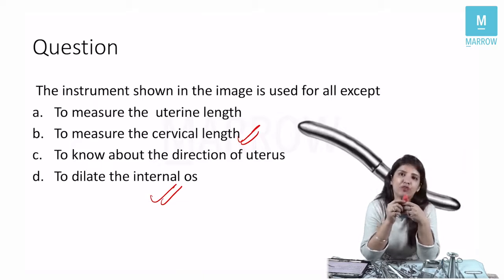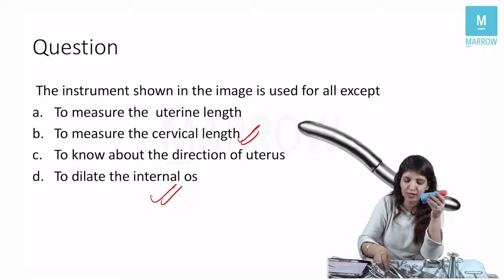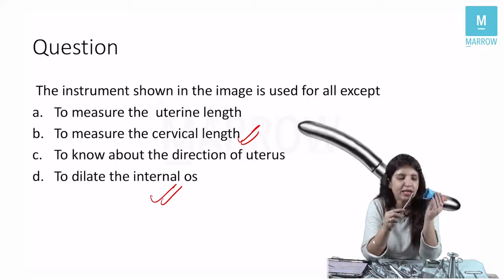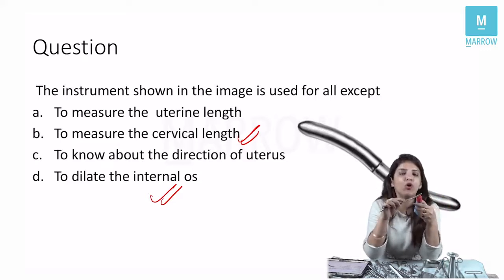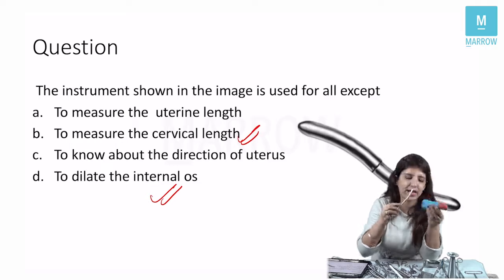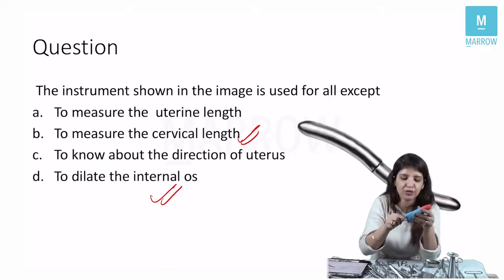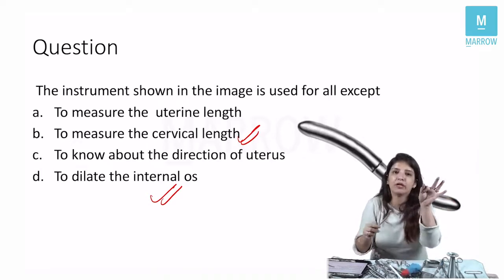In a non-pregnant female, if I have to diagnose cervical incompetence, I can use a number 8 Hagar's dilator. See, normally if the internal os is of normal size, when you put a number 8 Hagar dilator, the female is going to resist, right? Because the internal os would be closed.